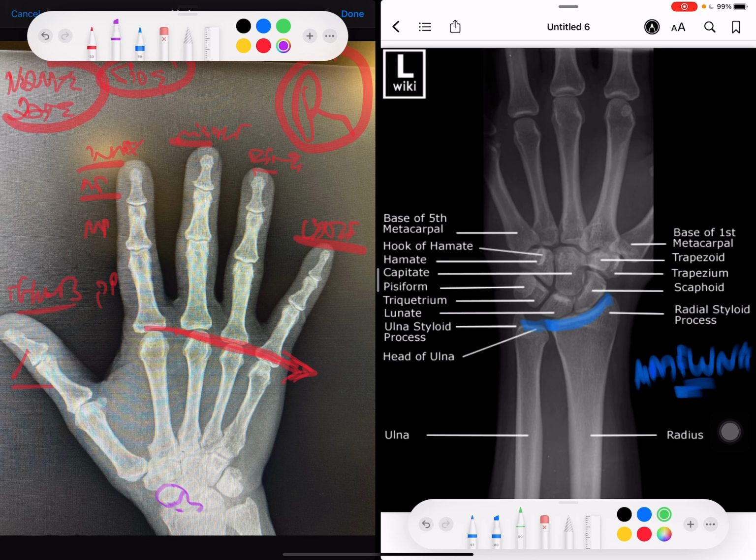They're not like this. Left like this? Yeah, no. If you fold your hand. No, no, no. This is image. Is it left? Yeah, that's left. Or like this? No, it's actually this way. Yeah. So when you flex them, it'll all point towards the scaphoid bone.